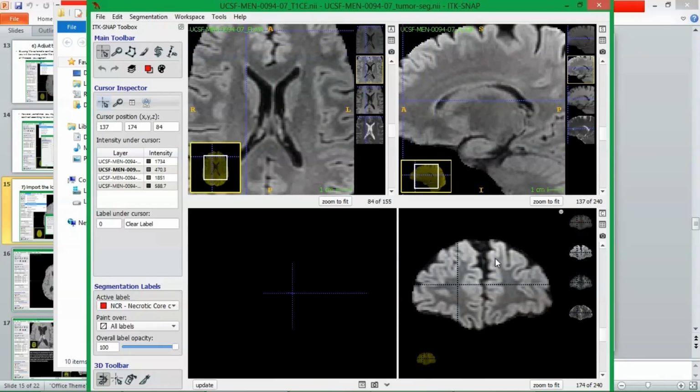Sometimes when I'm wondering if a small dot is actually a vessel or is really a metastasis, I might turn to those planes to evaluate the situation better and judge whether this small enhancement is a small brain metastasis or a vessel.